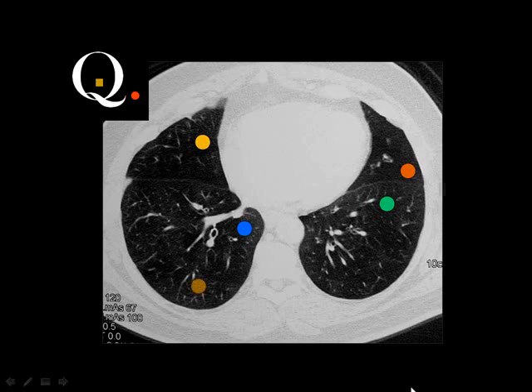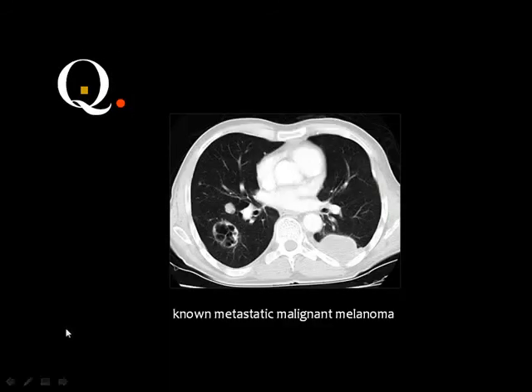Okay, and this is the posterior segment of the right lower lobe. And this, anterior of the right lower lobe. And this, lateral of the right lower lobe. Okay. Then you have here multiple metastatic deposits. One here, and this one, and this one. Where are these metastases? The lower lobe, bilateral. Okay, this one, posterior segment, left lower lobe. And this one, anterior, and this one, lateral.